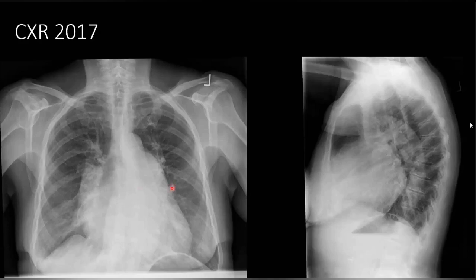But I thought that maybe this is the retrocardiac opacity coming over here. Then it is silhouetting the medial portion of the diaphragm. Then it's also coming over here, isn't it? Yes, sir. But sir, I'm also unable to appreciate the right paraspinal space. Maybe it is in the anterior mediastinum. Then there's a reason that you cannot see it on the lateral radiograph.